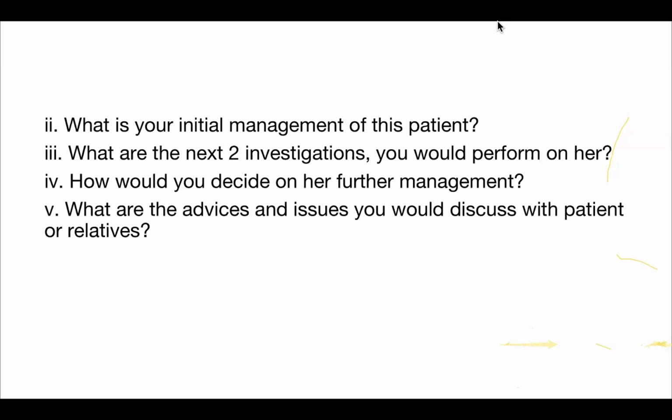What is the management? Is it cardioversion or defibrillation? So remember, it's cardioversion, right? It's cardioversion because for defibrillation, there are only 2 indications. What are the 2 indications for defibrillation? Pulseless VT and VF. We are not worried about whether we are feeling the pulse anywhere, because anyway the patient is not perfusing in those 2 rhythms, right?